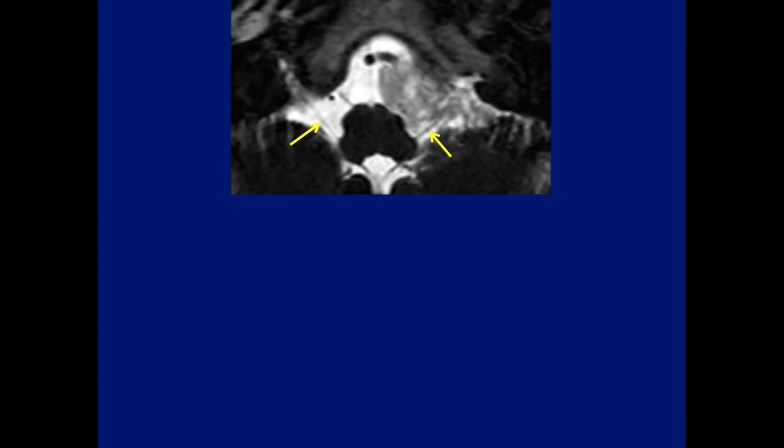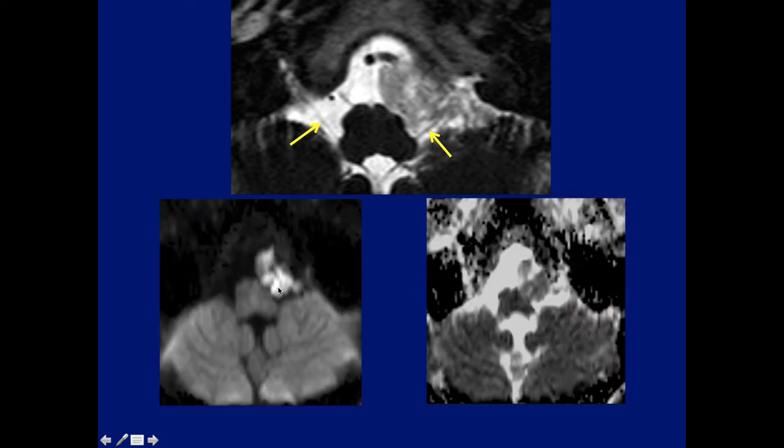Okay, what's the abnormality here? What condition is happening here? Correct. As Asif has said, and Gino, typical appearance of an irregular, patchy epidermoid, and of course the classic restricted diffusion.